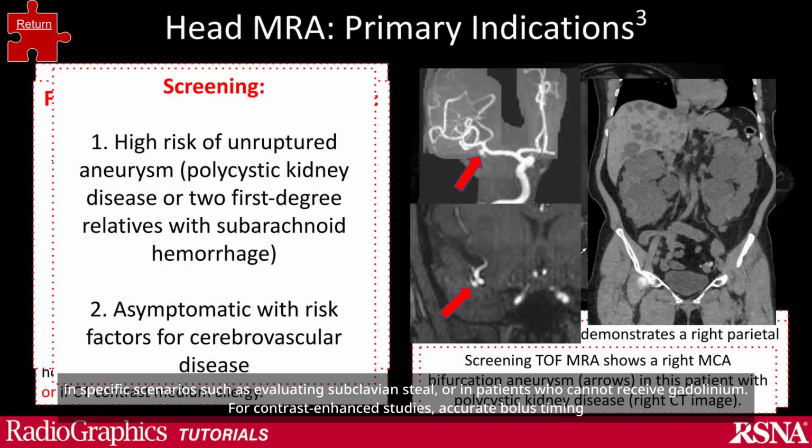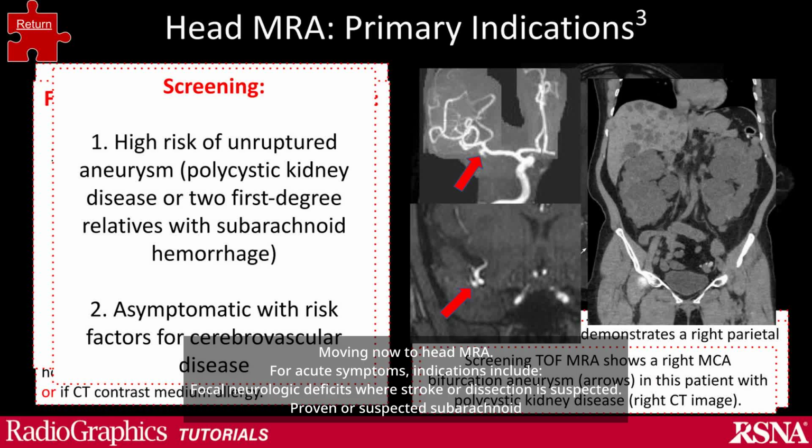Finally, MPRAGE sequences are indispensable for detecting vulnerable carotid plaques and dissections and should be part of every neck MRA protocol. Moving now to head MRA.